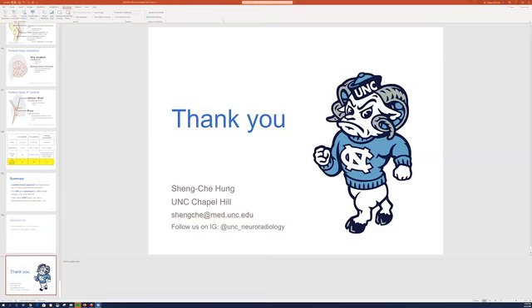How to differentiate ganglioglioma and the DNET in the temporal lobe. DNET, as I said, usually you will see a bubbly appearance and T2 very bright. The FLAIR might suppress the center part. The bright FLAIR depends on the size. But the ganglioglioma, in my experience, I see a lot of ganglioglioma in epilepsy patients. They might have different types, different image appearance.